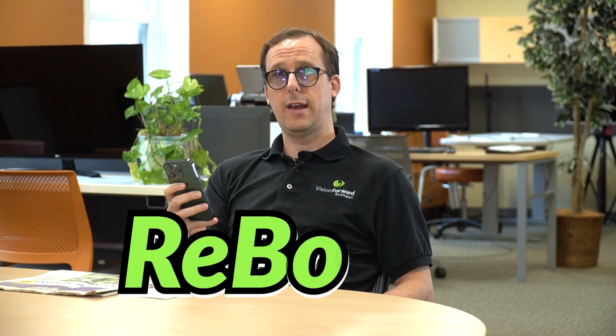Okay, so let's check out the features of the ReBokeh app. I have already downloaded it, but obviously you would need to go into the App Store to download it for yourself. It is not available on Android at the moment, but they are developing for Android. But yes, at the moment, just the iPhone. This is spelled, by the way, ReBokeh, so it's a bit of a strange one.